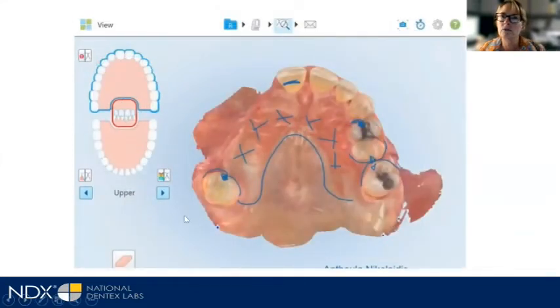And the same thing goes for partial dentures, right? So with a partial denture, you can take the scan. So this is the scan, again, a maxillary case. Most successes that I have experienced personally have been maxillary cases. You have better bone support.